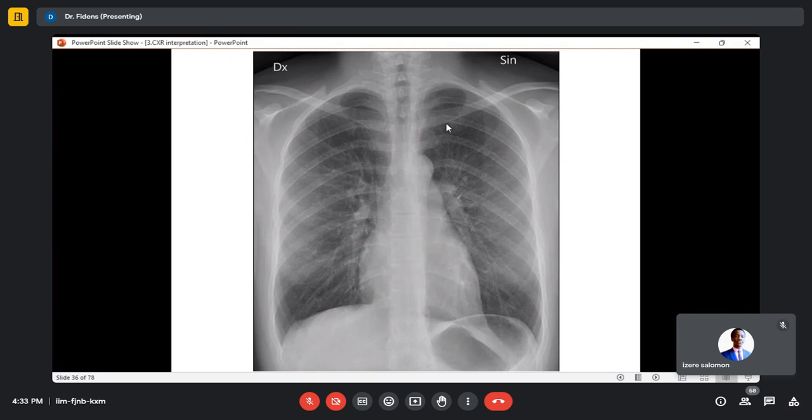After the bones, you go to the soft tissues. Everything that is soft tissue in the chest, please look at it. Starting with the neck: is there any neck mass, any neck lymphadenopathy? Is there any axillary mass? The chest wall, is it okay? No abnormality? And it is where we check the diaphragm. The diaphragm, is it okay? The orientation, the smoothness, the site, and even here you can think of abdominal organs, because, like the liver, sometimes you can diagnose a liver lesion from there.